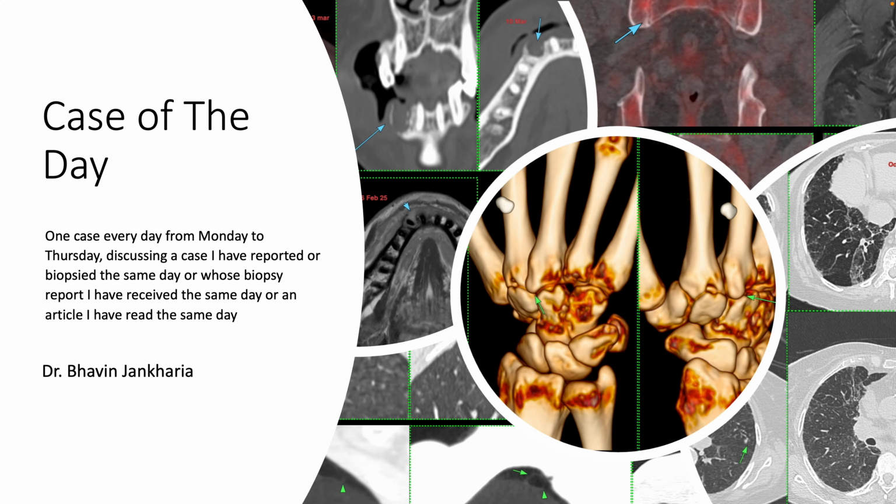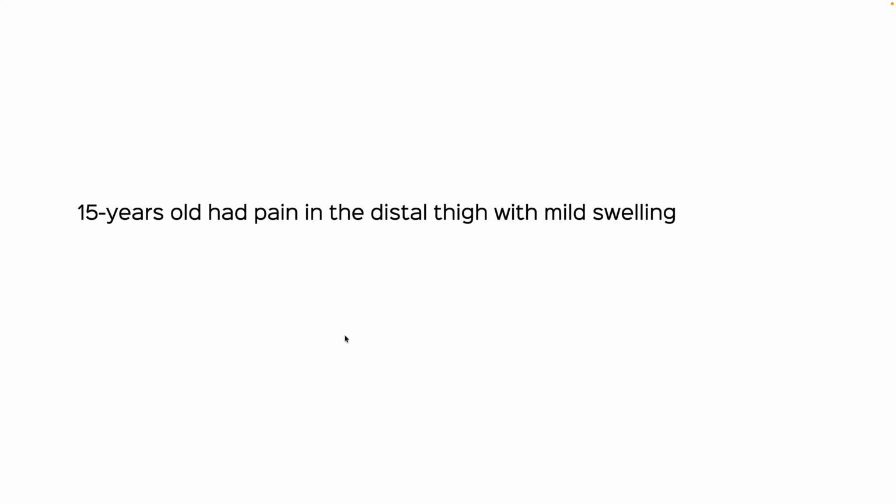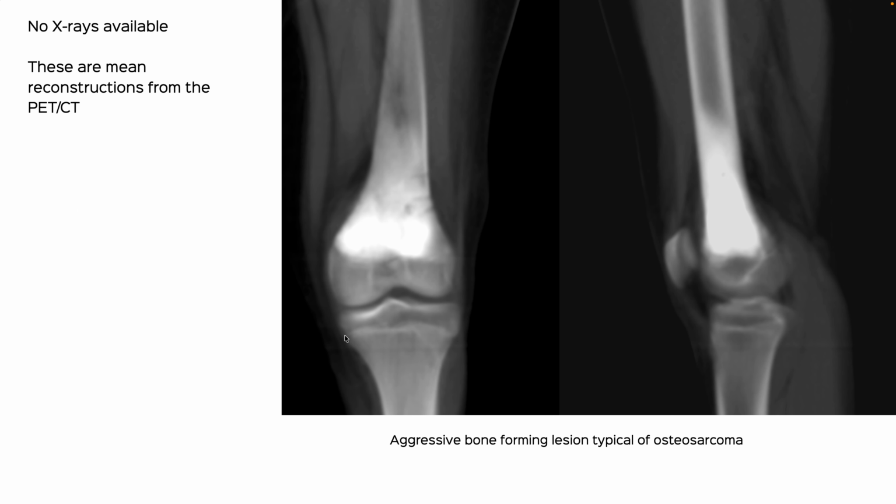So this is case of the day. Today is Wednesday and we have the 134th case titled Epiphyseal Involvement and the Skip Lesion. This 15-year-old had pain in the left distal thigh with mild swelling.